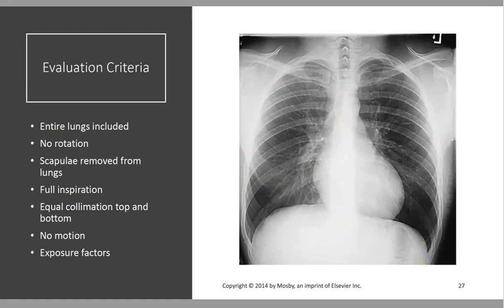Now I'm going to point out the sternal angles or sternal ends of the clavicles. So here we have a clavicle or collarbone coming down. We can see real clearly that this is where it ended, if you can see that shadow. And I'm going to highlight it here in red. So let's follow this left clavicle here. And we can see it here.